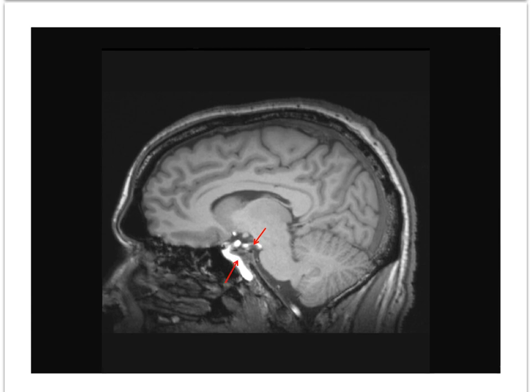This large white structure is the internal carotid artery. This broad band of tissue is the middle cerebellar peduncle, and we can see that very nicely also on the axial images.